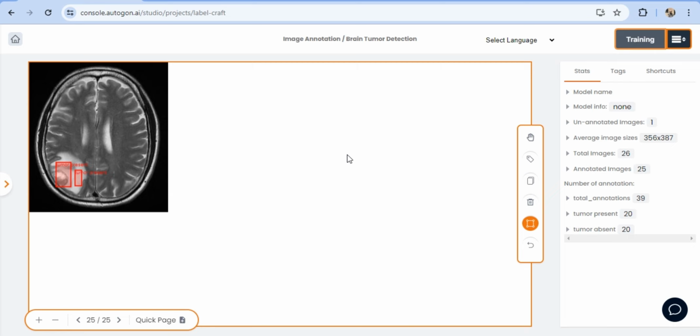Like I mentioned, we might not get very interesting accuracies here. The factor behind that, like I mentioned earlier, is that the number of images I'm working with is minimal. The epoch level isn't really high, but that's not really a factor though. It's basically that the images I'm working with are very minimal, so we might not be able to get those predictions right on call, but I'm going to show you how that will be done, and how you can do that on your own.